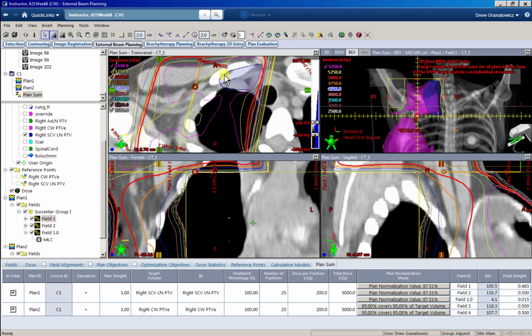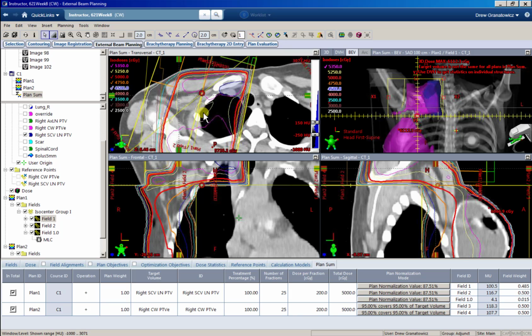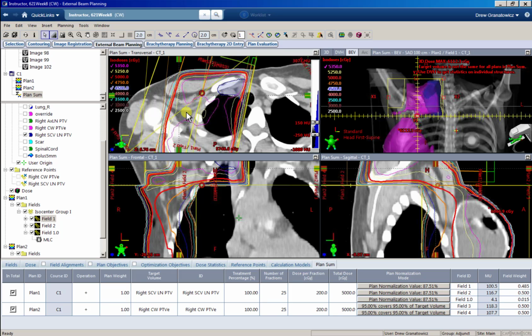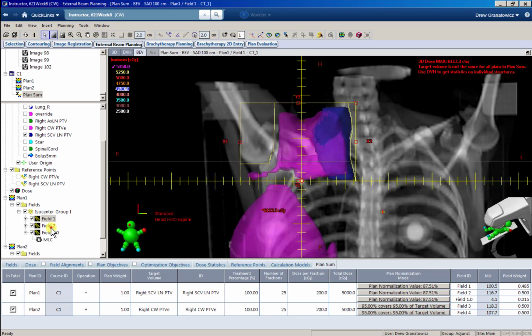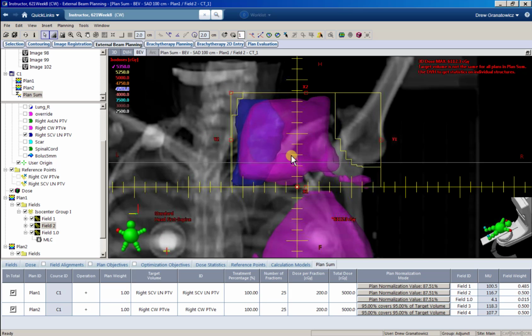So I always need to block from this side. Well, if I always block from this side, what ends up happening is you can see our 107 and even our 105 is already breaking up over here laterally a little bit. So if I block from my lateral side too much, I end up causing holes here, and sometimes that's no good. So if you rotate this to 90, and you don't always have to do it, I'm just showing it to you on this one because it's just a little trick that I picked up. But now we can block from the top. We don't have to always block from this lateral side. In case holes start to appear, we don't have to block from this medial side. We have just another option.